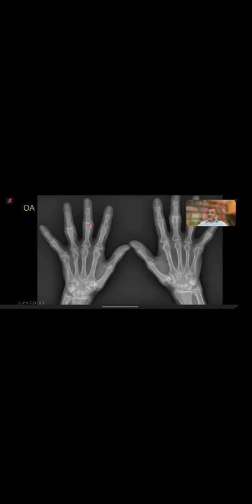And here you can see the undulating surface, marginal osteophytosis, more loss on this side, less loss on this side, and osteophytosis is more on one side. Okay, on the other side, you can see there's a cyst as well, maybe some enchondroma there, but look at the osteophytosis is more on one side.